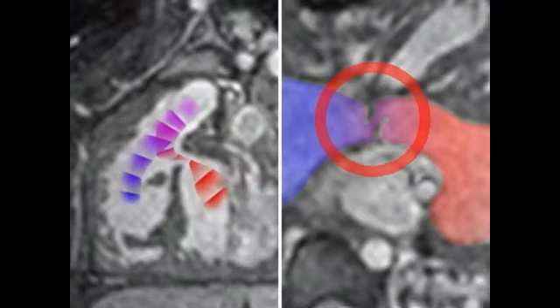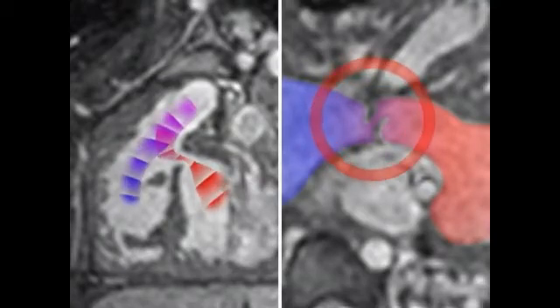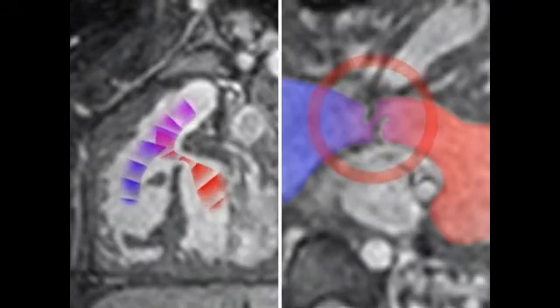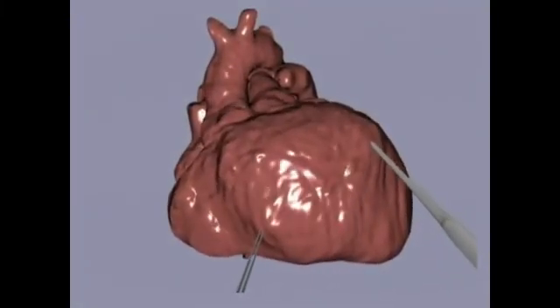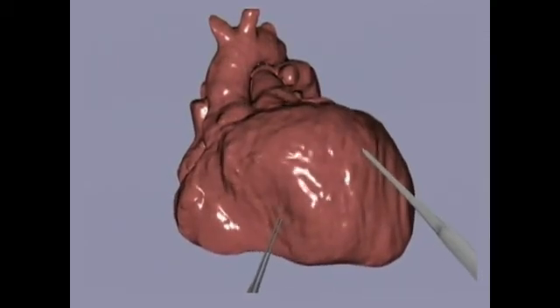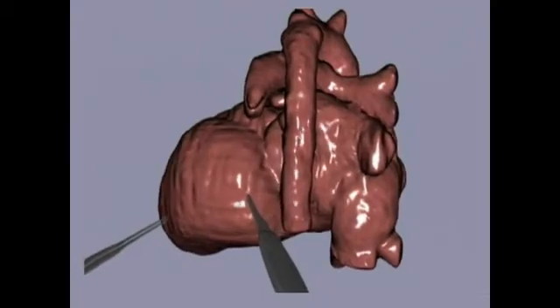It is the surgeon's job to repair these deficiencies. Untreated, they would cause breathlessness, poor weight gain, and an increased susceptibility to infections. A real-time cardiac surgery simulator was recently developed. It allows pediatric cardiac surgeons to evaluate different surgical strategies preoperatively.